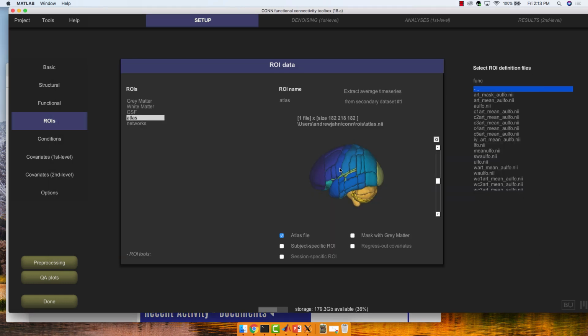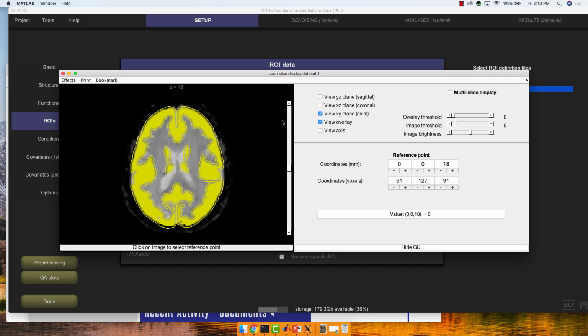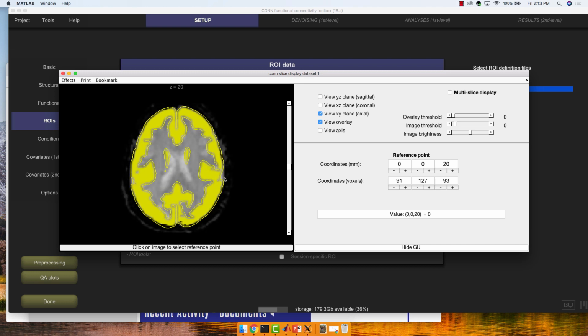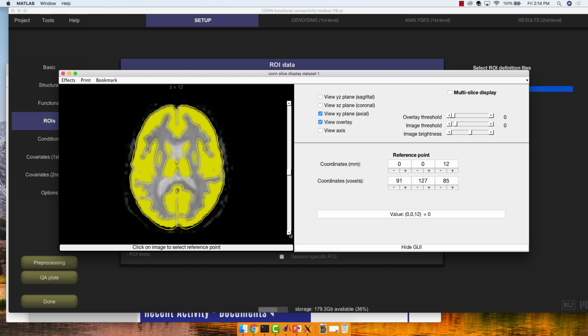So if you click on this particular figure, you can see where exactly this mask was. All right, so we got a gray matter mask. Uh-oh, is that an artifact? What is that? Any other guesses? In yellow? Ventricle's right here. What's next to the ventricle? Any subcortical stuff? Yeah, that's what it's trying to mask out. It's not going to do perfect. Okay, there's going to be a little bit of bleed over, but you can start to see things like the globus pallidus, putamen, caudate, things like that.